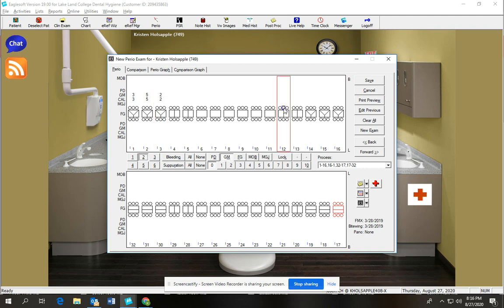So what you would do is click on the area, and then click the negative sign, and then put, when you probed, where that gum level was, and then all the way to the CEJ. You'd kind of feel for the CEJ. So see how it says -2? Then, because it's a fake pocket, it's not really adding in. Does that make sense? So let's go over here.